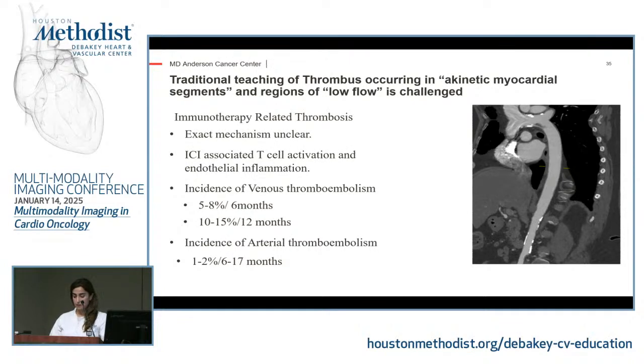This is a patient that was just imaged by PET imaging a couple of days ago, and they called and said, hey, we see a filling defect. The patient went through some immunotherapy regimen that we don't know what the immunotherapy really is. They're on a clinical trial, and they asked me to review. We did a CTA, and there's this thrombus within the aorta that was relatively new within a month. The patient was already on anticoagulation for a prior history of PE, so they clot often.